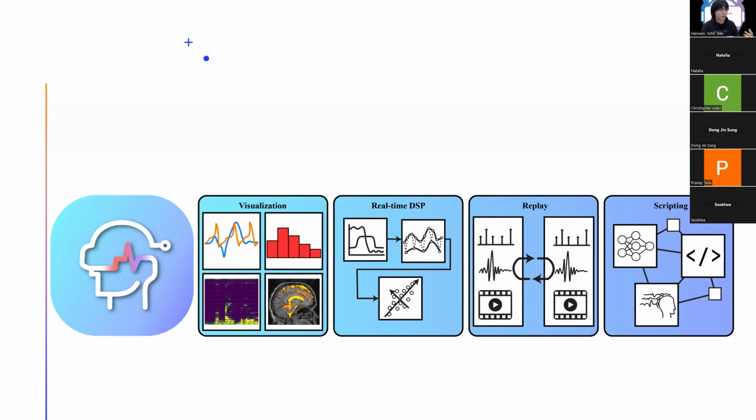And you can add your customized data processing signal pipeline. You can record the data and replay it. And you can also add a scripting interface to your data processing pipeline. The scripting is one of the most powerful features in PhysioLabXR, and we will dive deep into this during the session.